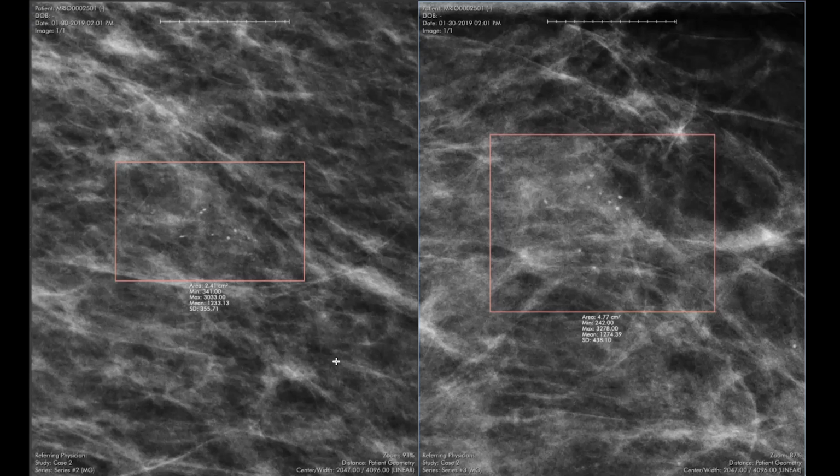And they are spanning about a centimeter, a little over a centimeter, so the distribution would be grouped. These are grouped round or punctate calcifications that we saw on a baseline screening mammogram. This is the second good indication for a BI-RADS 3. So this was given a BI-RADS 3. We had the patient follow up, recommended for 6 months, 12 months, and 2 years.